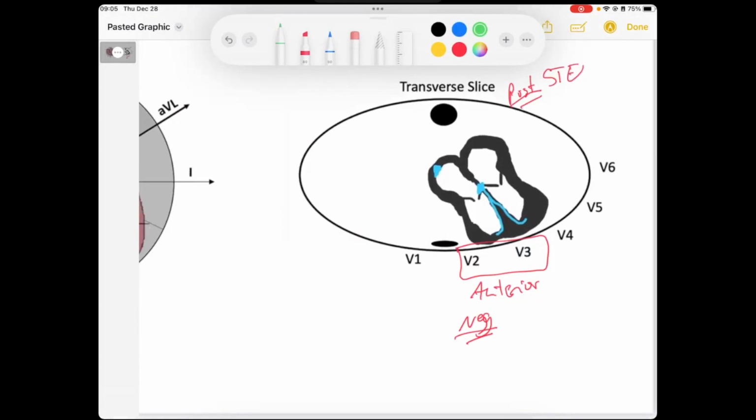And how can we check for that? So anytime we see this major anterior lead depression, we should think, I wonder if something's going on in the posterior portion of the myocardium. So the best thing you can do to check is take V4, V5, V6, and actually place them on the back. And what you're going to create is a V7, V8, V9. You're just displacing these stickers in this fashion, and you get an EKG.